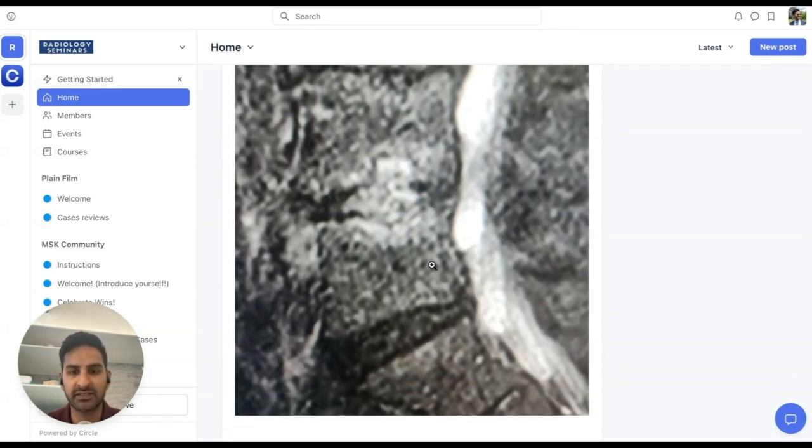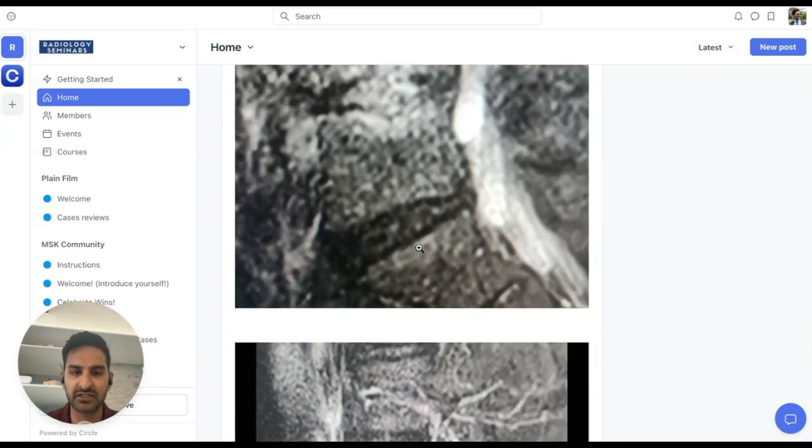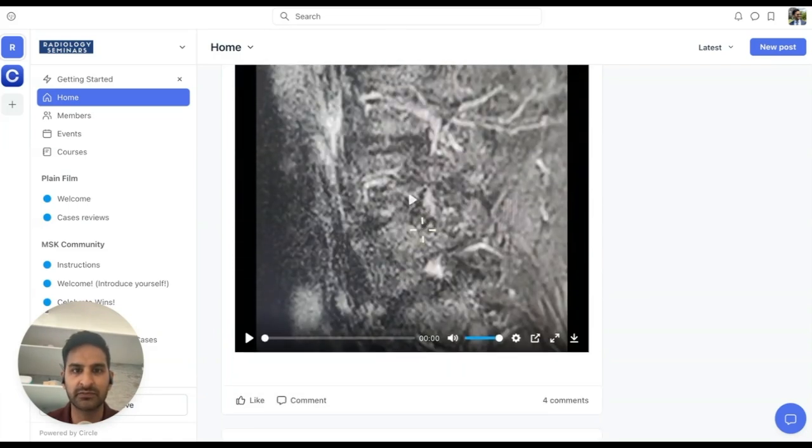This one you can see we're probably at L4, L5 of the lumbar spine, and you've got this indentation there, and some adjacent bone marrow edema. I was worried about discitis, but actually the disc looks very normal, and it's mainly around the indentation here and here. So I'd be more concerned that this would be in keeping with a reactive Schmorl's node.